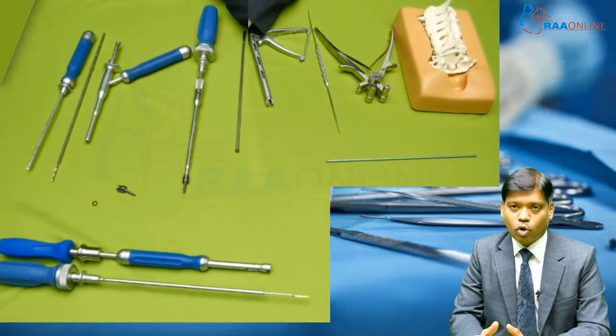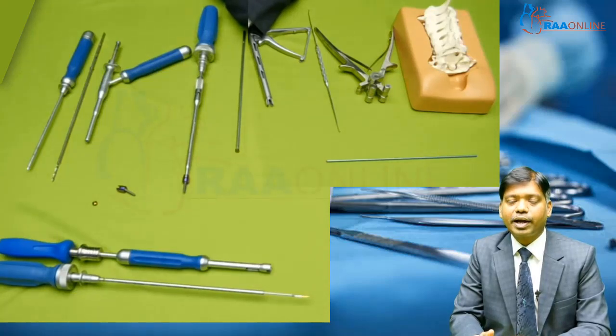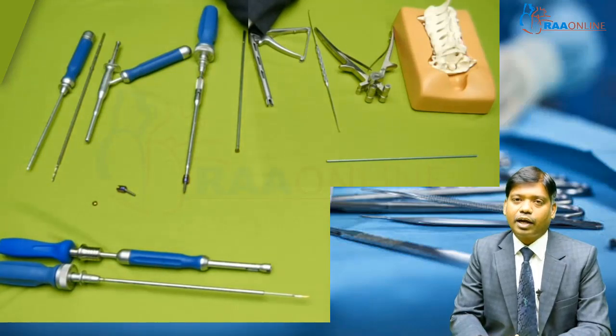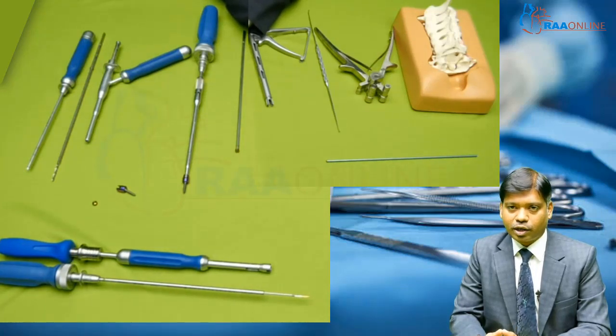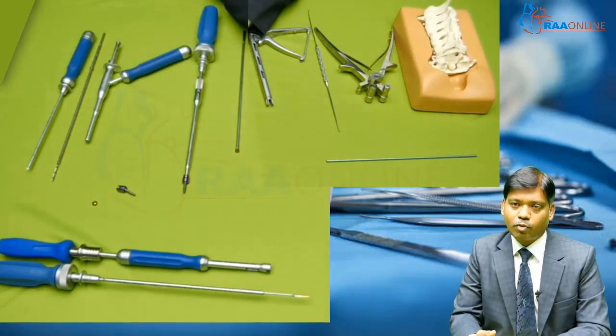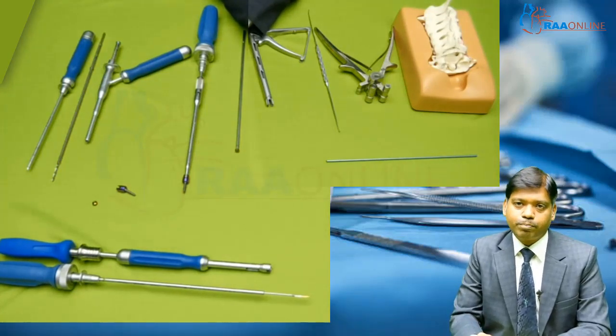Because of the various complications related to cervical spine pedicle screws, though it is a biomechanically superior construct compared to lateral mass screws, we commonly use lateral mass screws for the cervical spine. Having said that, I have been using cervical pedicle screws for the past 7 years, and I have not been using lateral mass screws for many years, because I feel cervical pedicle screws are biomechanically much more superior and stronger. And if you have been trained and have reached the learning curve of how to use cervical spine pedicle screws, it is always better to use them.